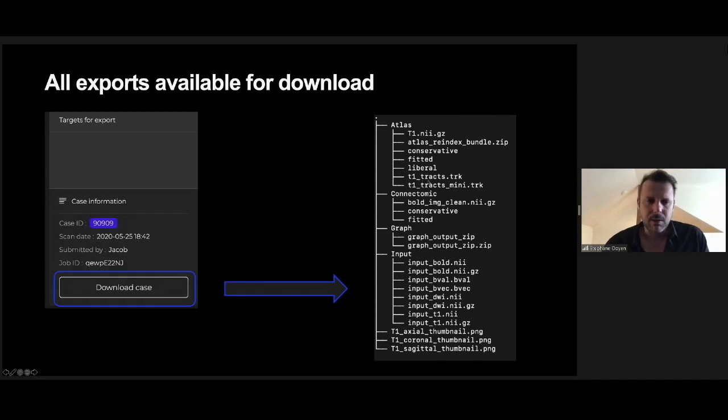You get the tracked files as well when you want to run analytics on some of the tractography imagery and bulk process hundreds and hundreds of scans. That's for the anatomical and the structural. You're also getting functional data. So you're getting the bold processed signal, as well as the correlation matrix computed for you, which you get in the shape of a CSV, based on the machine learning atlas or the extrapolated machine learning atlas, or even the generally fitted, sorry, non-machine learning atlas that Michael demoed.